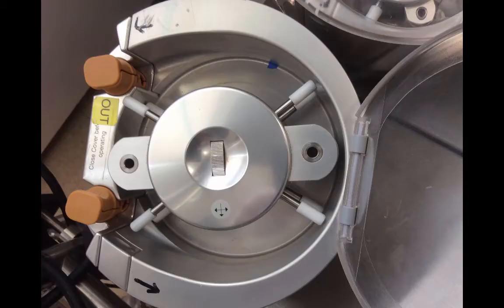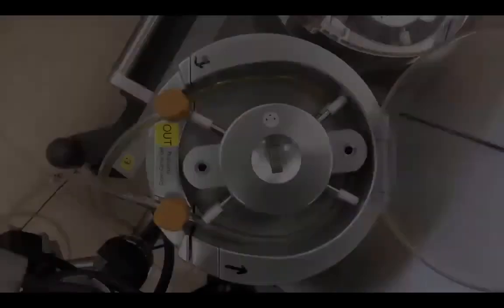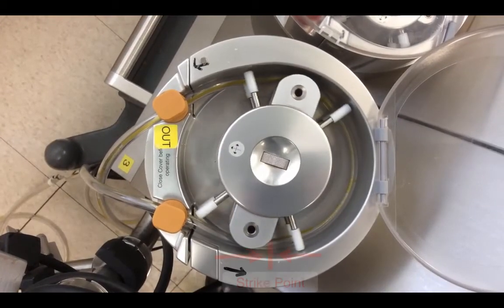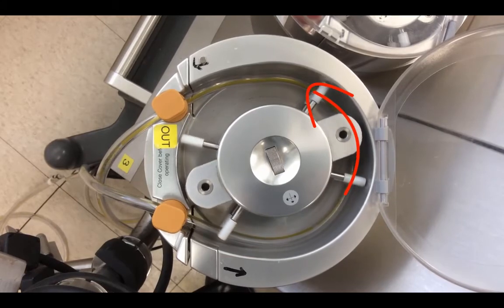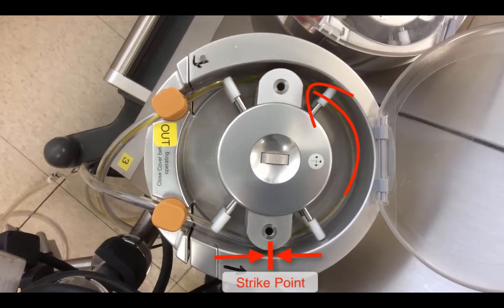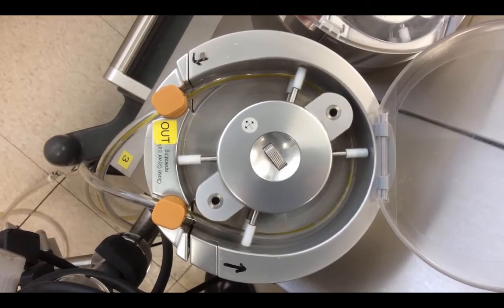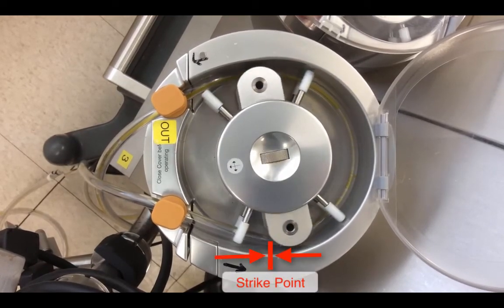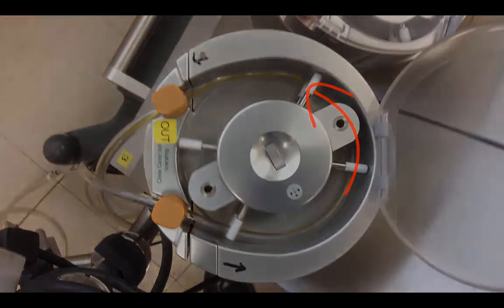Roller pumps generate flow by compressing PVC tubing between steel rollers and a rounded metal raceway. As the roller head rotates, the roller pinches the tubing at the strike point and continues to move the point of compression around to the other side of the raceway. As roller number 1 is rolling off of the raceway tubing, the second roller is rolling on, and thus continuous forward flow can be generated.